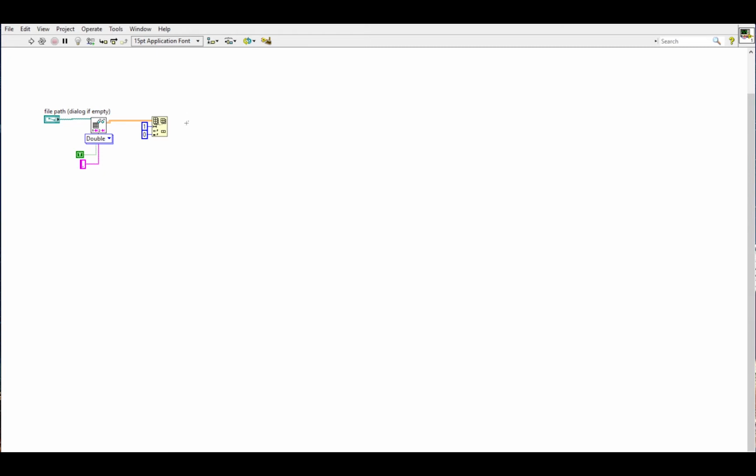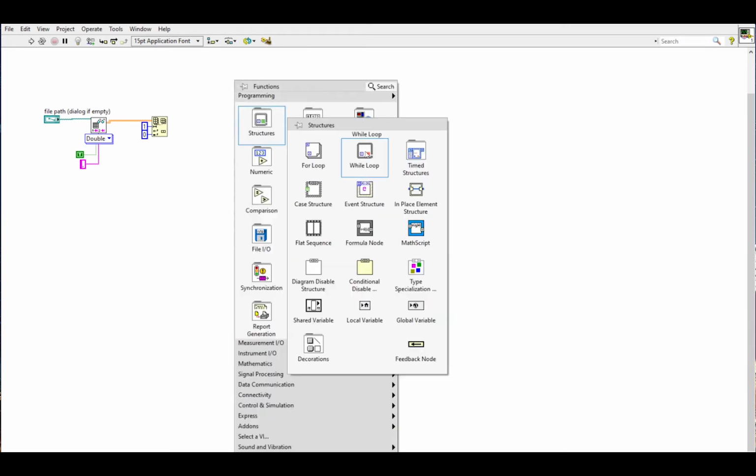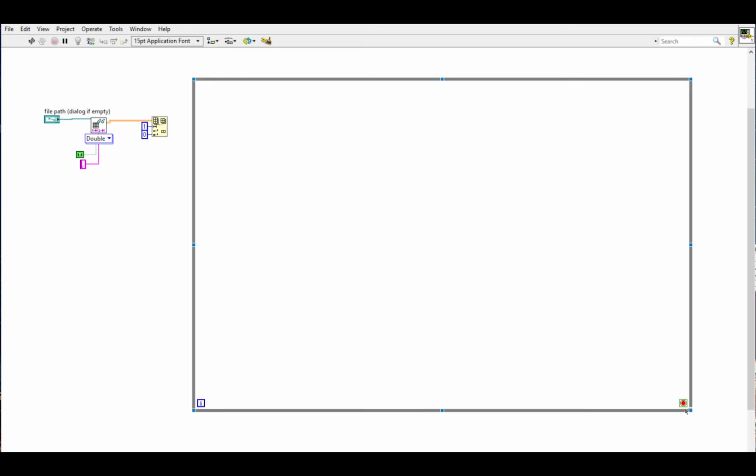Now, since we're going to want to play around with the settings of our filters, let's put everything into a while loop. A while loop allows us to execute all of our code as long as the stop condition isn't met, meaning that everything will run continuously until we press the stop button. So let's create a stop button by creating a control. If you forget this step, your code won't execute.